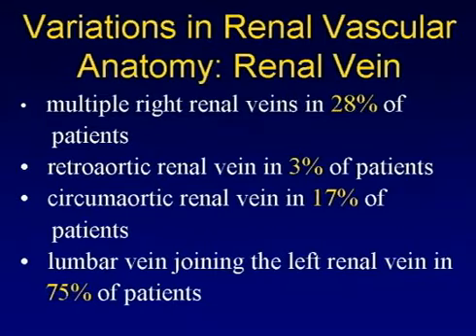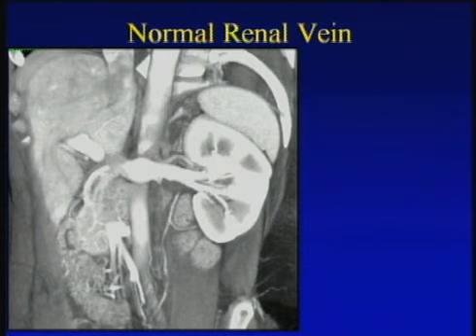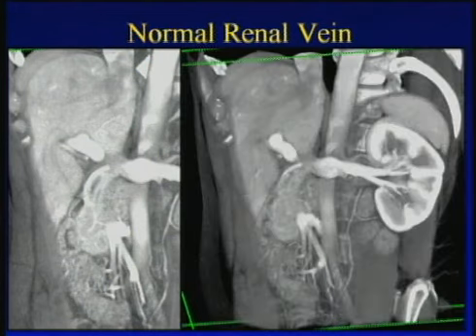Same thing in terms of renal venous anatomy. Variations are very common. Most of the time they're not important, but with laparoscopic surgery, particularly for donors as well as nephrectomies, they become much more important. Classic venous anatomy, 70 seconds tends to give you a very good visualization without any issues related to flow. And you can see it very nicely here.